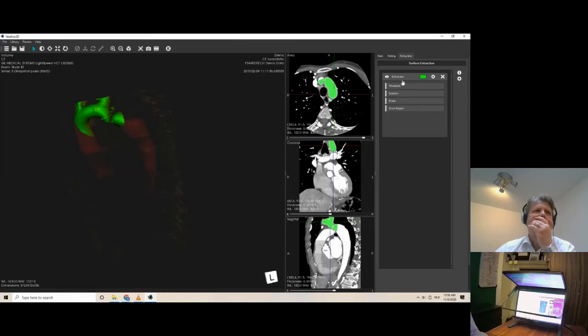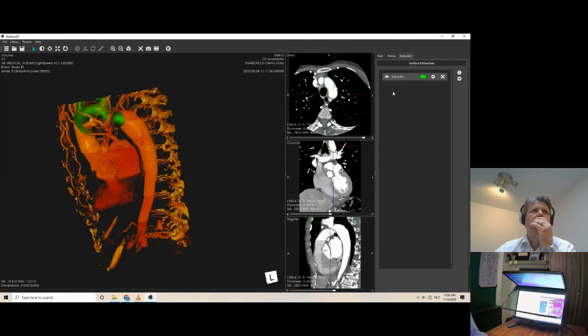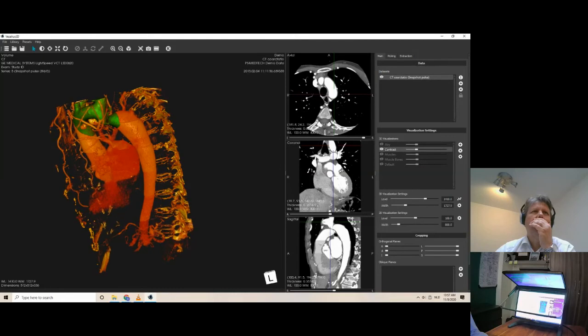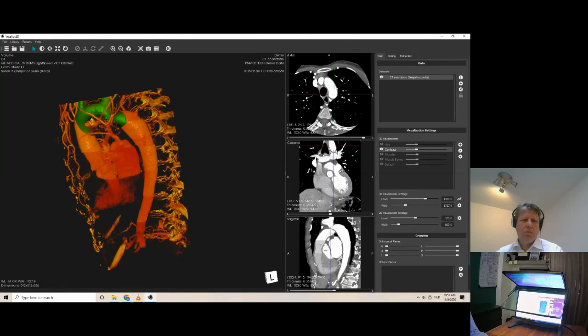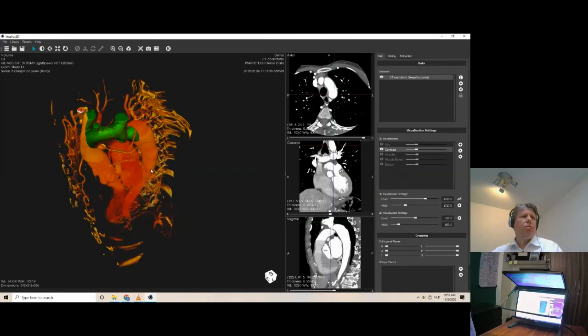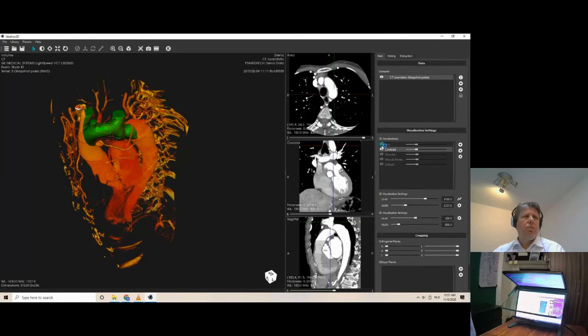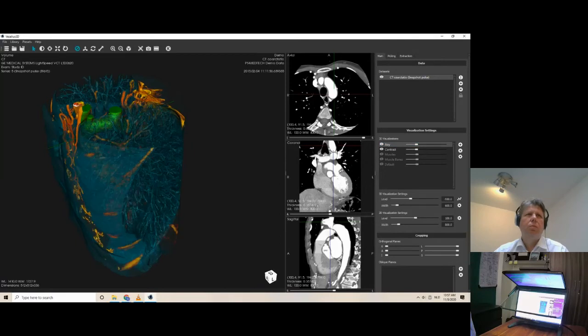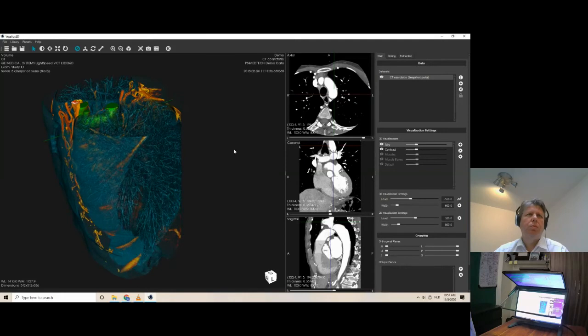This is another button that Mark taught me, which is very powerful, in my opinion. You hit it. Here you see your original data set. So you have your original data set combined with the selected area, the one that you can have 3D printed. You can go through it, you can have a look at it, you can have it printed, show it to your colleagues. You can show different visualization settings, show the whole surroundings. It's all about structural information. And there it is. Beautiful.